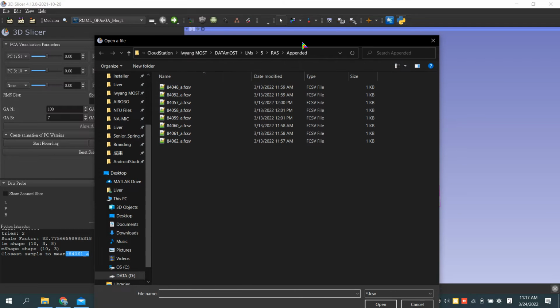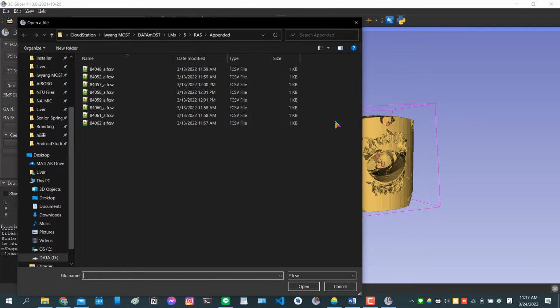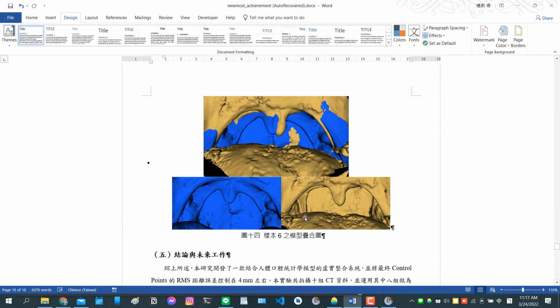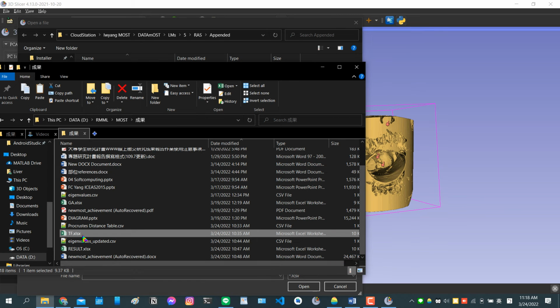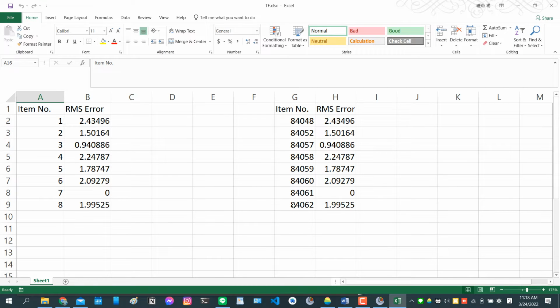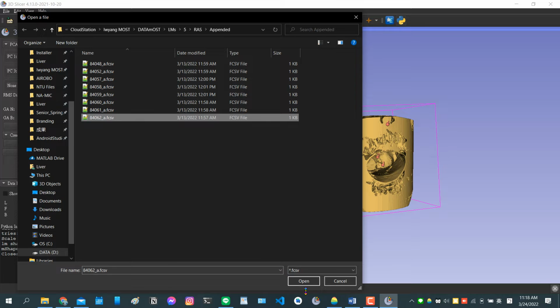So in here you select the sample you want this mean average mesh to turn into, and we will select let me check, and I think we will select sample 8, and sample 8 is let me check, sample 8 is okay. So we will choose the target landmark.